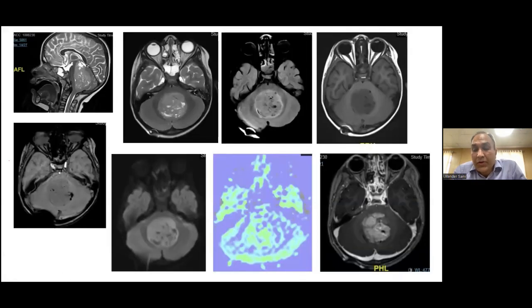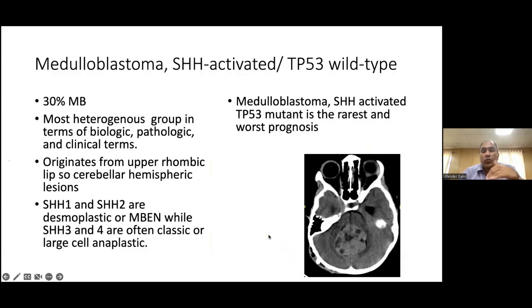And on spectroscopy, the 2 things which are very important for them are the posterior fossa location in relation to the fourth ventricle, and that they show marked diffusion restriction. You can see hyperintensity on diffusion weighted imaging, and ADC will be just black here. T2 signal also is not very bright. They tend to be lower on T2 signal, and they may show variable perfusion. And on spectroscopy, only a choline peak will be seen, no other peak is seen, indicative of very high cellularity of these lesions. Even the hyperdense appearance on CT scans is indicative of high cellularity.